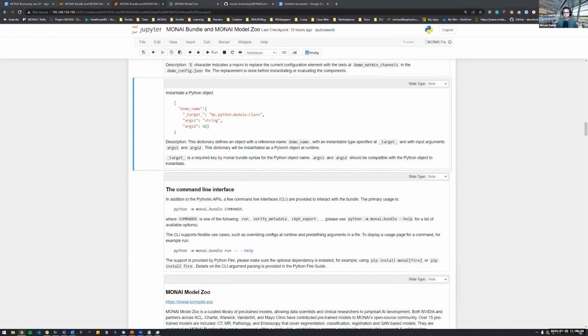So we have this nice modular network. We could instantiate that into this config file, give it some parameters that might be passed into it. Maybe it's always a 2D one and we want to default to 2D, whatever other things we might need. And then people can always override that later as well. But yeah, it should work well with any custom model or any custom function that you might want to integrate into the workflow for it.